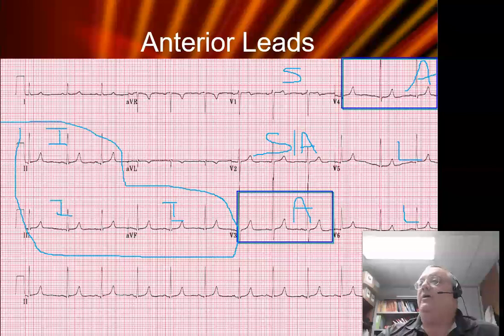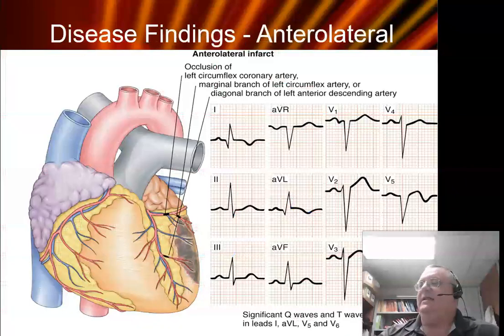Now, if you can remember these guys here, the anterior wall, septal wall, lateral wall, the only other two that you need to remember are these two guys right here. That's also the lateral wall, but I will tell you that that's like the upper lateral wall, okay? Let me explain what I mean here. I click ahead. So the anterior lateral wall, okay? So it's not only affecting here, but it's also affecting the side wall of the heart, okay?